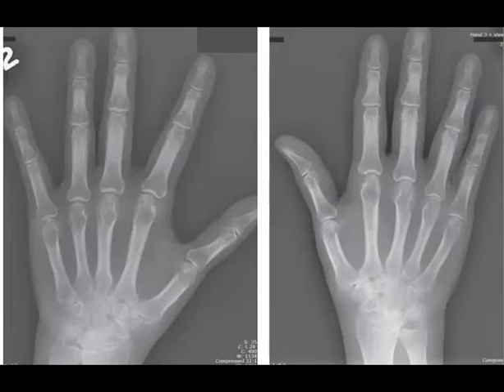Yeah, and they like to mention that one of the most important sites to search in rheumatoid is the ulnar styloid process erosions and the metacarpophalangeal joints, right? And the proximal. Okay. So they mentioned that the second and the third metacarpophalangeal joints have the early changes of rheumatoid arthritis. Okay. Gout can also be included in the differential diagnosis.